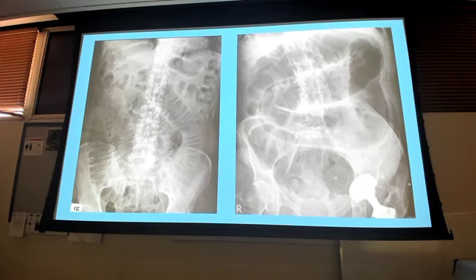Okay. Which is the bowel where the issue is stemming from on the left picture? Small. What about the right picture? Large. Is there small bowel involvement on the right picture? Maybe. Does it matter? No, because there's large bowel involvement, so I know the problem is in the large bowel. Doesn't matter if there's small bowel in there or not.